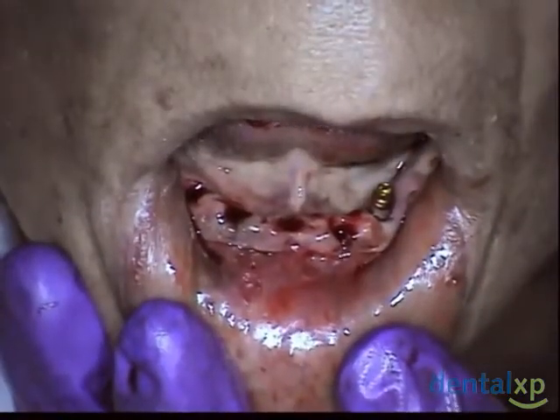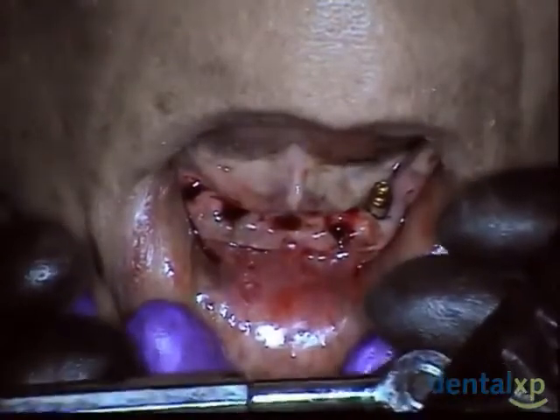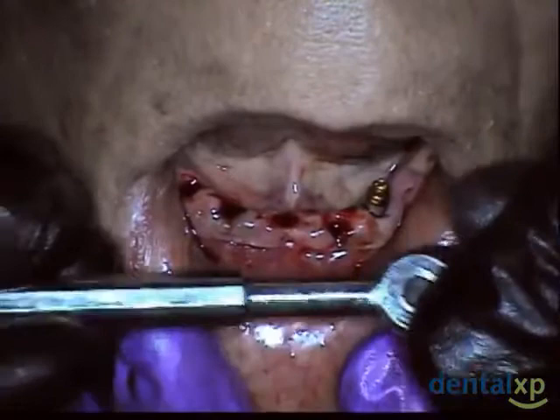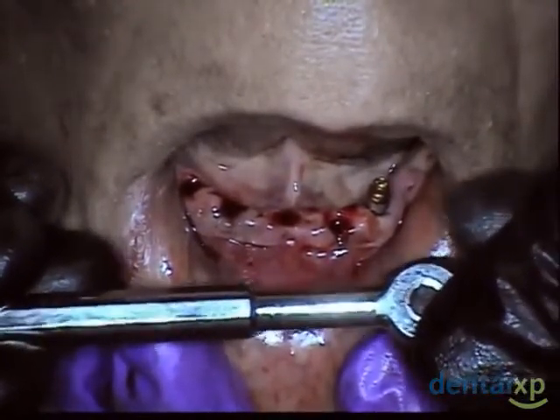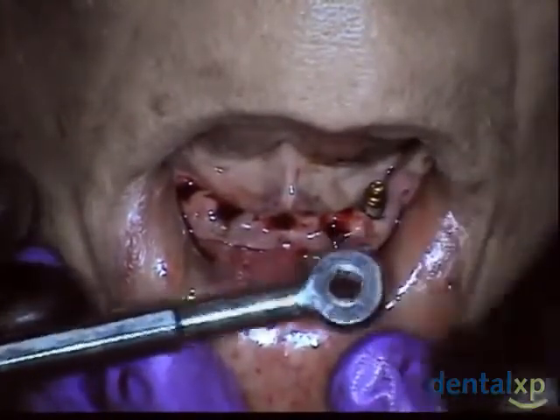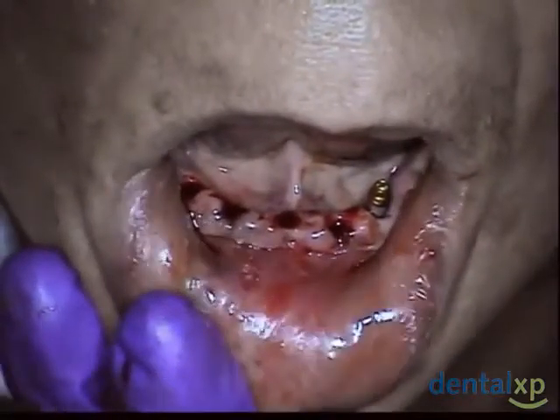Now, here are 2 types of drivers. This is the one that was originally in the kit, and you can see it's got a longer arm. Longer arm means that you are able to place more force. More force means that you may be going beyond the biological limits of what the bone will take, and therefore you may seat the implant, but you might have pressure necrosis in that area.